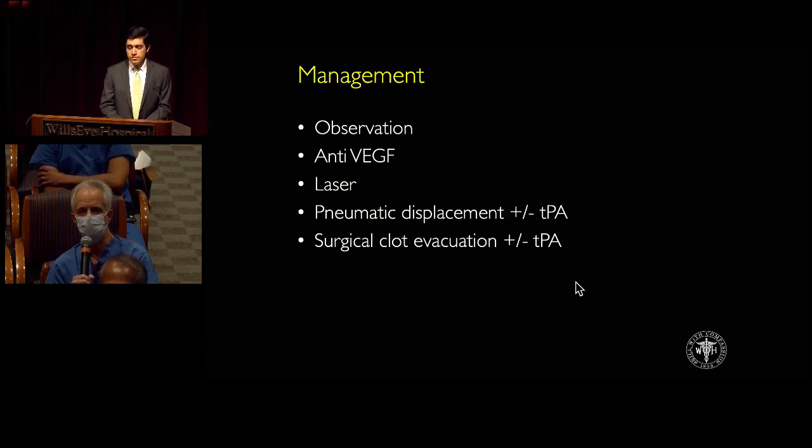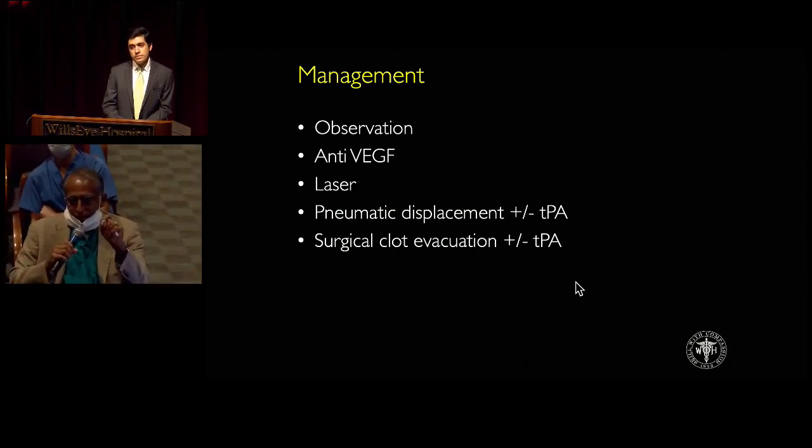Again, that's really for lipid and fluid in the macula that's persisting in the presence of an aneurysm, usually along the temporal arcades. Yeah, and with the exudates, just along the supratemporal infratemporal arcade, direct or indirect laser around the macroaneurysms really works very well. Even when there's exudates coming in, you can dry it up pretty well with or without the anti-VEGFs.